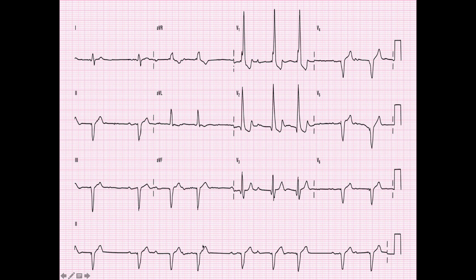Here again is where your calipers that you already bought, totally have them in your hands right now, come in handy, because your P waves are still going to march out. So if you take your calipers, measure your P to P, you can just start flipping them over and they're going to march out pretty easily. So it's easier to find these buried P waves.